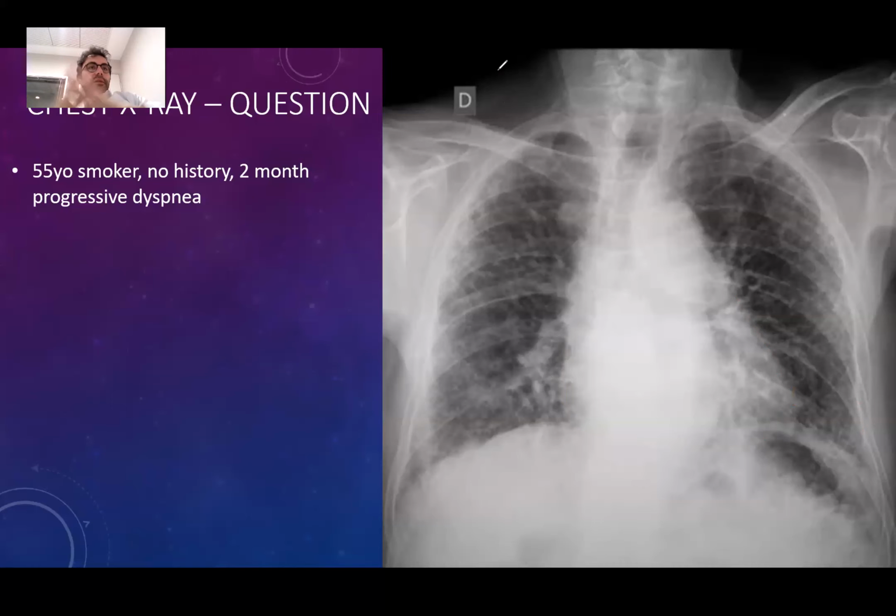So what can be this patient, for example? You questioned something systematic, which was good. Thank you for that. Could it be COVID-19? In COVID, it should be more like consolidations, right? It is patchy consolidations. It should be more hazy. Can it be miliary tuberculosis?